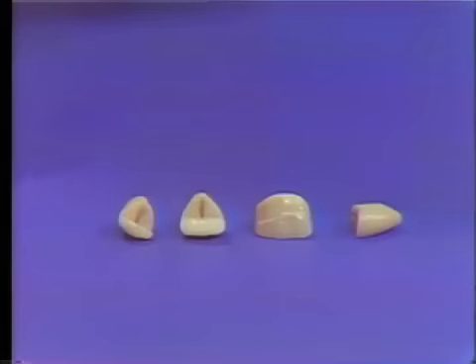They're not used so extensively now as they were, but you will come across many clinical cases with this type of bridge in situation and may need to repair it. Repair is carried out, of course, by just selecting a new facing of the correct shade and mold, making any necessary adaptations to it by grinding and cementing it back in position. When doing repairs, it's often convenient to use the resin facings rather than the porcelain. They're a little easier to grind and less likely to fracture than the porcelain ones.